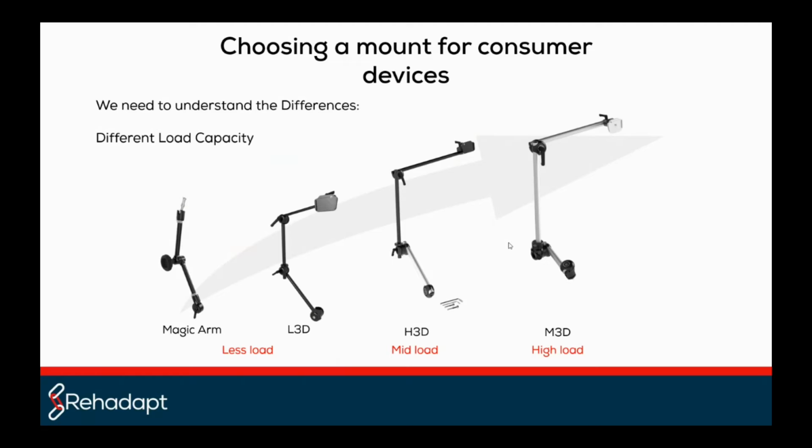So as explained, we have the Magic Arm and L3D mounting solutions. So the black arms here, for example, for situations where low or less load will be applied, and also customers with cerebral palsy, they often are not the same like someone else.